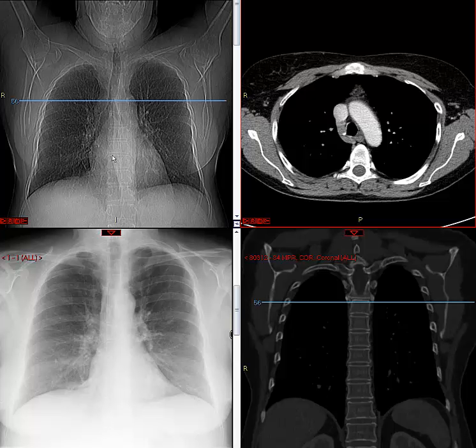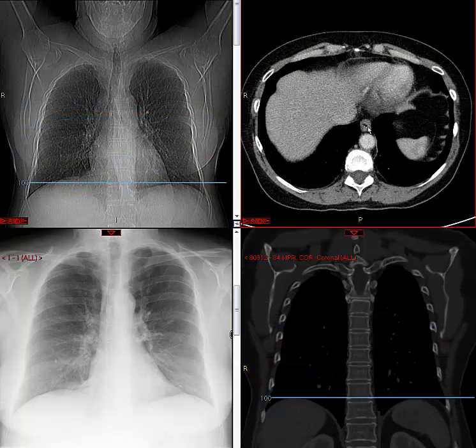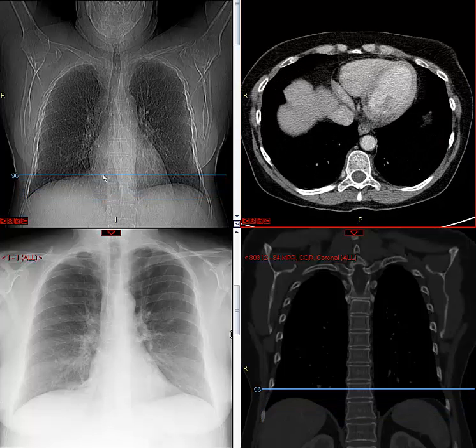And this azygoesophageal line is important clinically too, because this is normal, but if it were to bow out, it might bow out because the esophagus is dilated, or because there's a hiatal hernia from the stomach making its way intrathoracic and bulging out that line. Or it might be prominent because of paraesophageal mediastinal lymph nodes. Again, from cancer, they can become enlarged, and so if you see a nodularity or bulging out here, you have to think about enlarged lymph nodes as well.